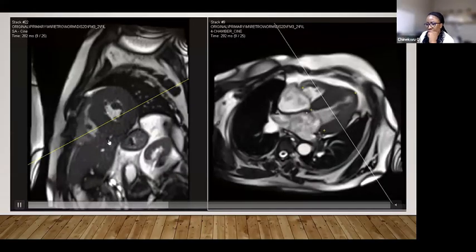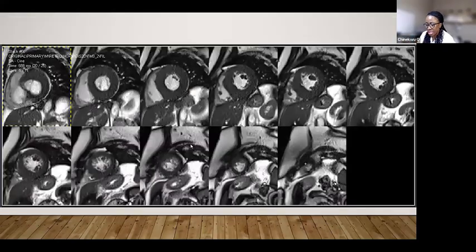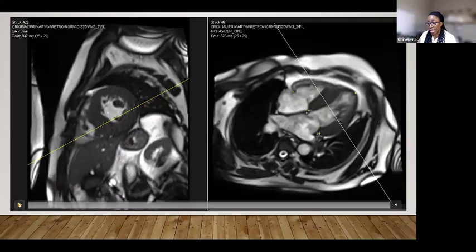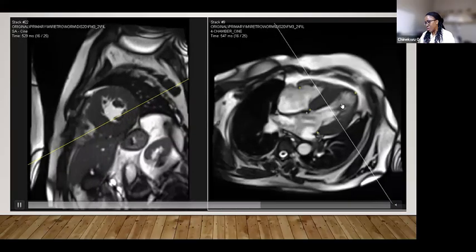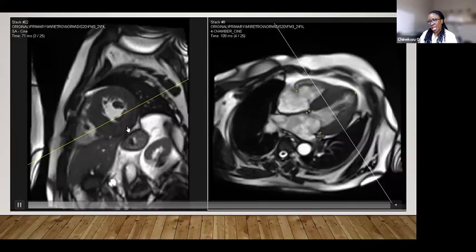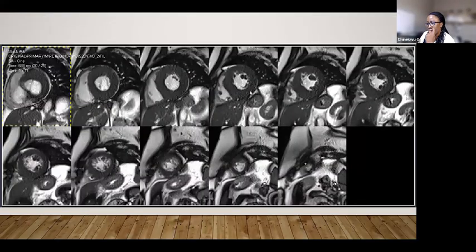So this is MRI. We can see the cines. We can see that this LV wall thickness is concentric and it is quite thick. I think when I measured, it was about 24 millimeters, so certainly abnormal. Now, if we look at the long axis, we can see that the base and mid cavity are not really contracted, and there's minimal longitudinal motion here, but the apex just seems to be doing a bit more. And that's sort of what contributes to that strain pattern you eventually see.